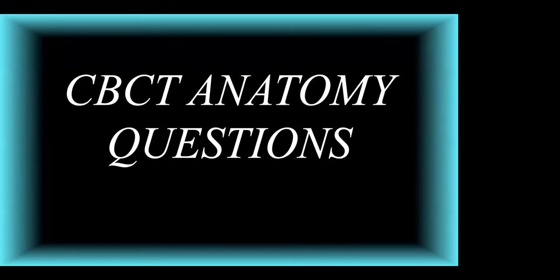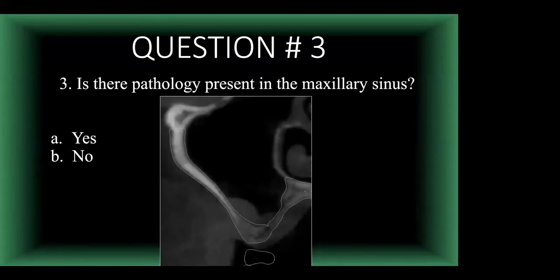So let's next go to some basic CBCT anatomy questions. I always like to throw these in just so you can look at every aspect of this case.